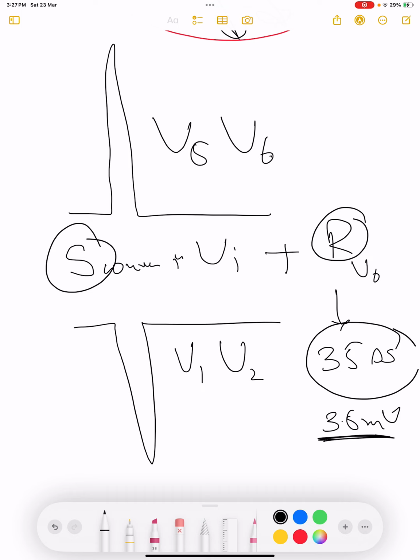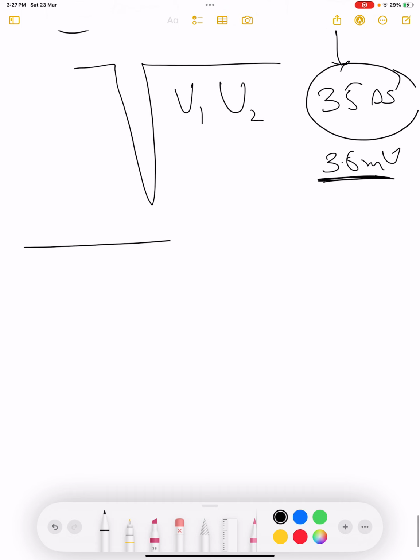So in left ventricular hypertrophy, you will see huge QRS complexes either on the positive side or negative side. In V5, V6 or lead I, aVL, they will be on the positive side, and in V1, V2, they will be on the negative side. Okay. And in what condition will the QRS complex be small?